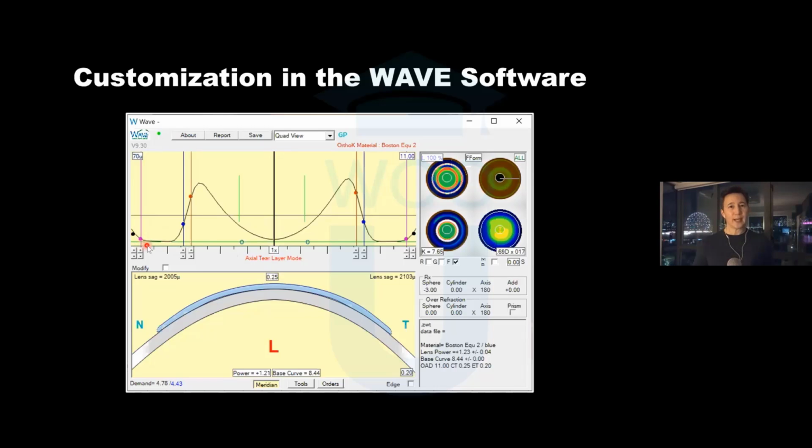You can move those data points in or out to alter, of course, where you're going to get the vault, where you're going to get the landing, the depth of that point in the contact lens, making it closer to the eye, farther away from the eye, the specific micron elevation that you want for the back surface of that contact lens. And as an example here, we could alter this data point right here, this pink one, move it slightly in if I wanted to create a wider edge lift. If my patient were struggling with catching that edge to pop it out.